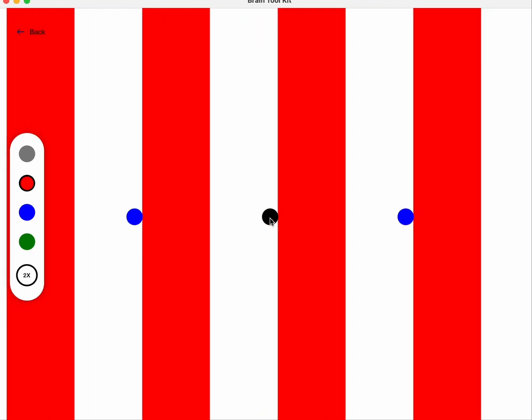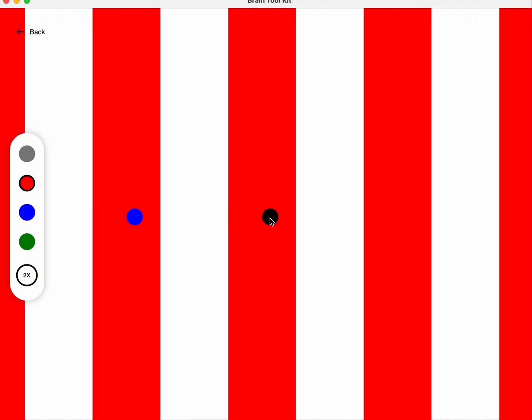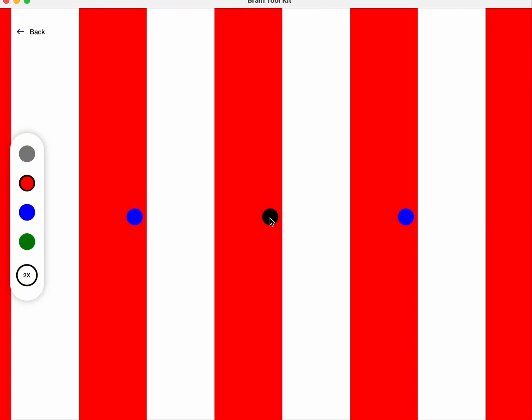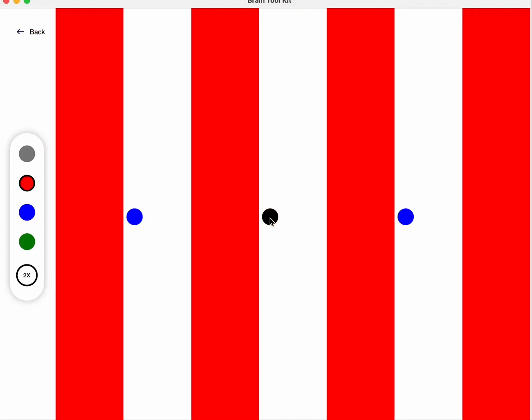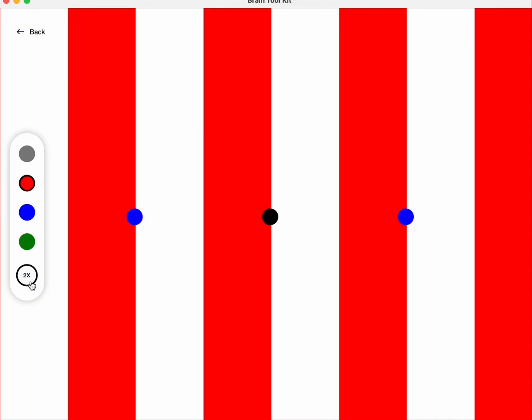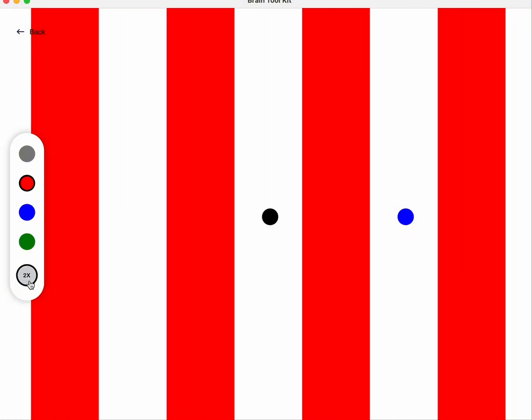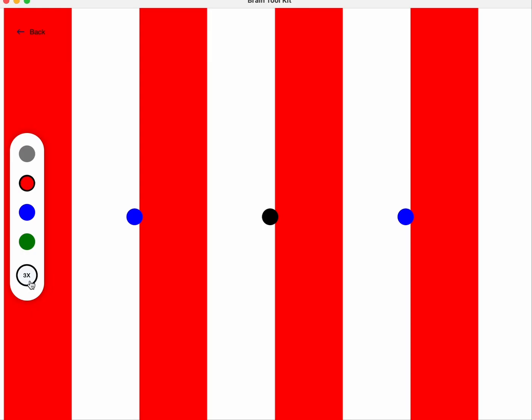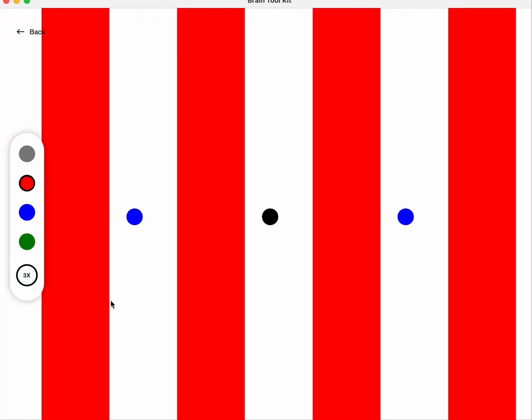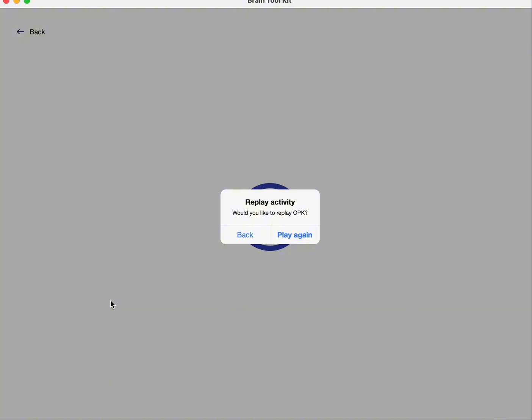For this specific example, the user would be looking at the center dot and then looking to the dot that flicks and back to the center dot. And the great thing about the OPK is that on the side, you can just increase the speed without having to go back out to the menu. And if you're using it on your iPad or phone, you can just touch the screen and swipe with your finger to change the direction.